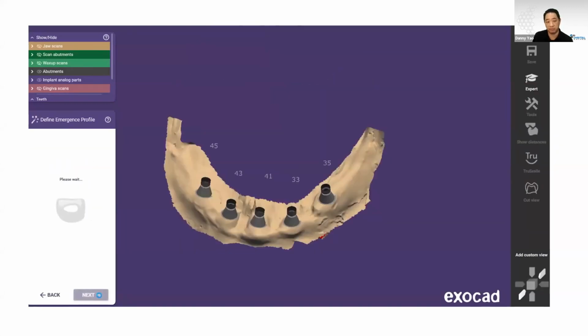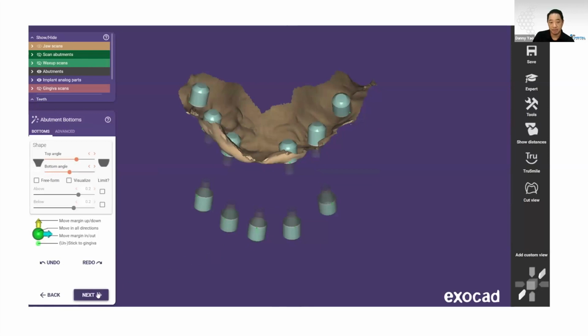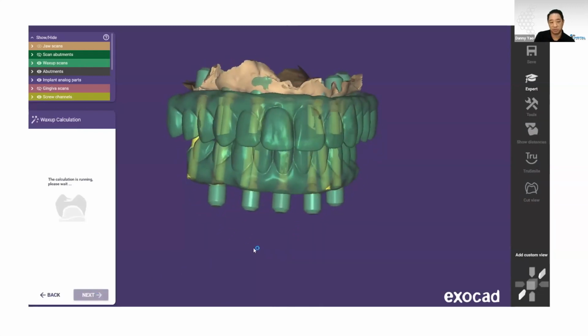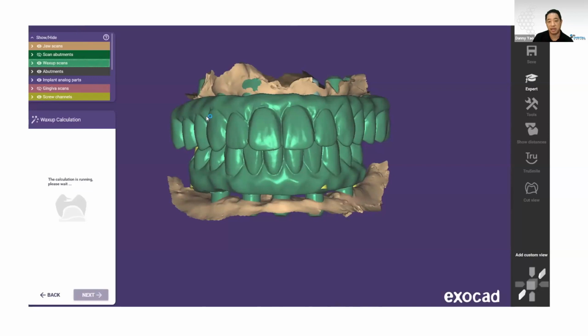Normally at this point you would be going through your design of your wax up, and then designing your smile design, doing that whole thing. Just because right now we're showing you the alignments and how to use our library, we didn't feel it was necessary, or I guess it was outside the scope of this. We would want to recommend a lot of different Exocad courses with partners that we're working with to really understand how to do smile design effectively.